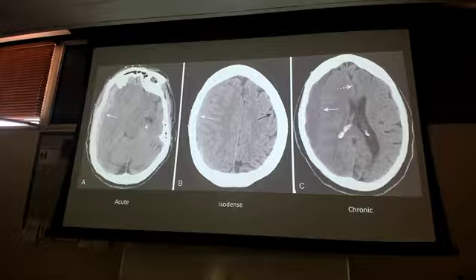Patient's right. CTs work the same as x-rays. I don't have a right and left marker here. In most CTs, you don't get one. But we know my left is the patient's right, my right is the patient's left. This is a right-sided bleed. So you can call that with just the image.